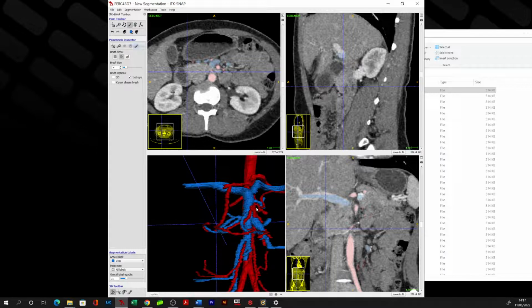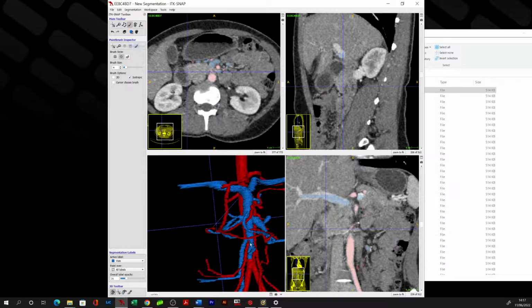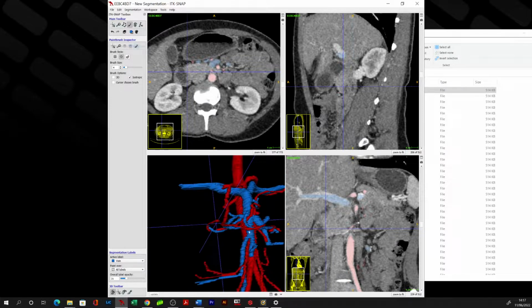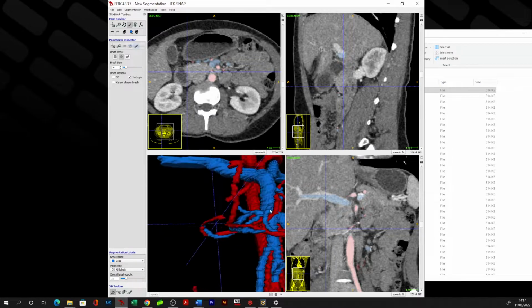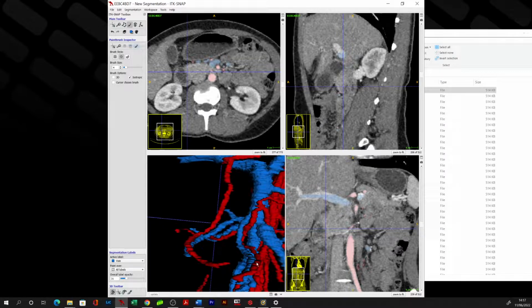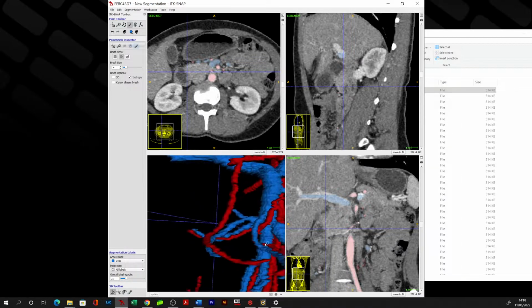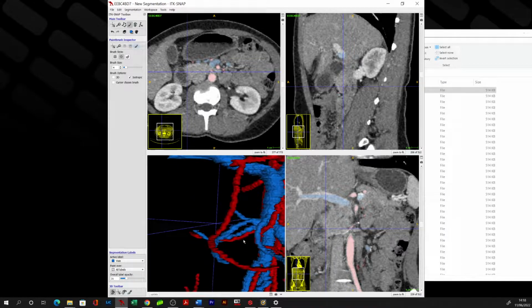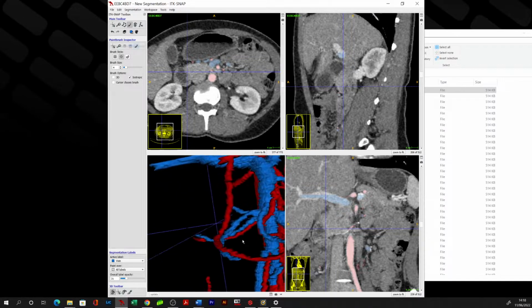I think the difficulty in this case that I'm struggling with is whether you'll notice that you've got this bifurcation of what I think is MCV. So the common trunk is here, and then it bifurcates into two vessels, one accompanying this distal branch of the right MCA rather, and one accompanying this other terminal branch of the right MCA. So I think the difficulty is that in this case, you've probably got a GEV and an ASPDV.